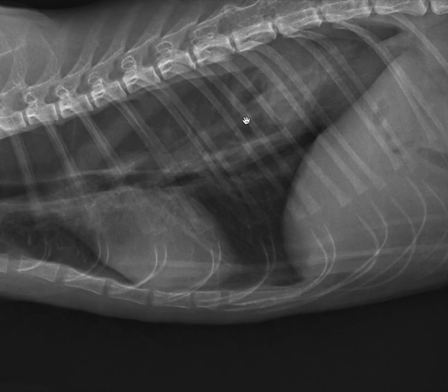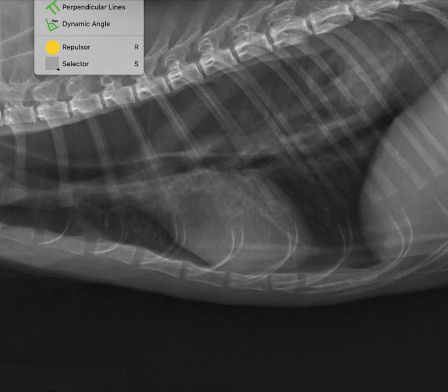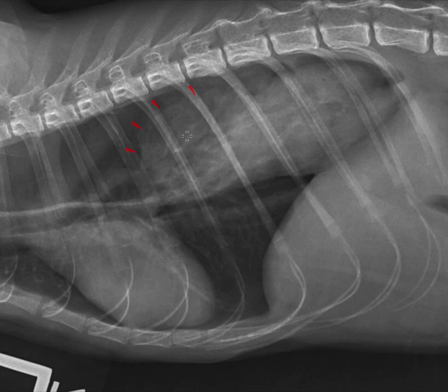This is starting to make me think about pathology involving the esophagus because of the location. Now, let's look for other findings of esophageal disease. When I look at the cranial thorax in this case, I see reduced opacity consistent with gas, and I see a very faint opacity here, which is a summation of the esophagus and the tracheal wall, termed a tracheal stripe. The dorsal aspect of the esophageal margin is all the way up here. So on this right lateral view, I think the esophagus is large.